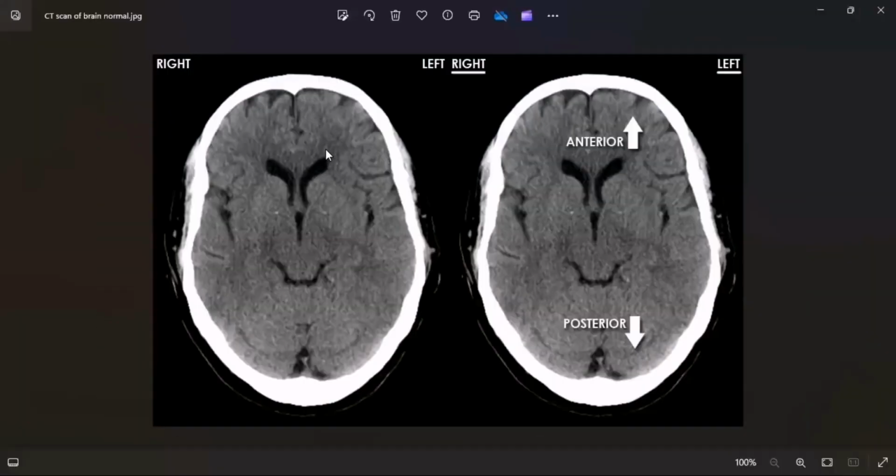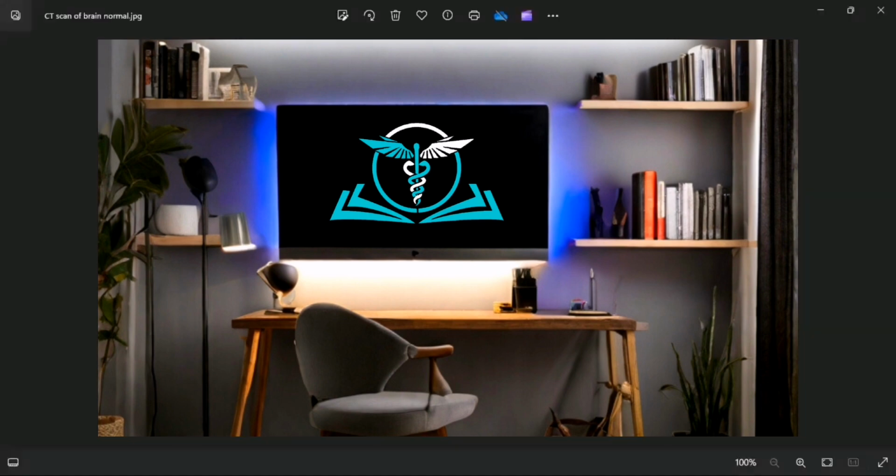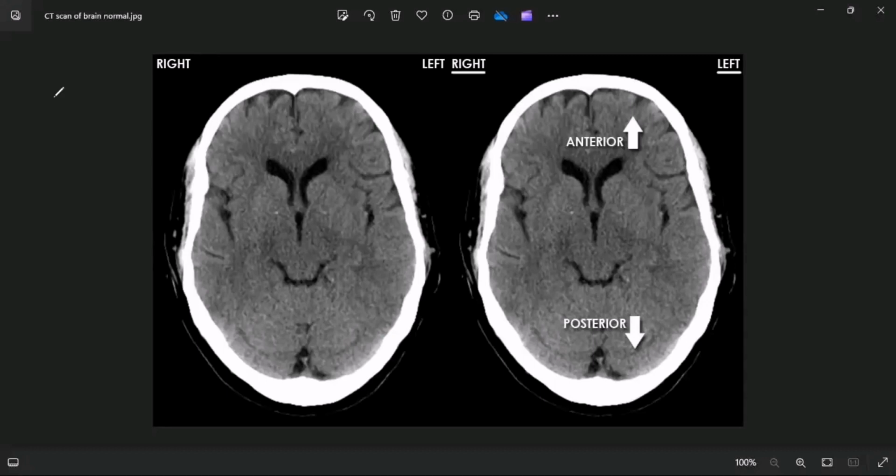So if you are a lesion which is whiter than the brain, do you see how the density is, or how the whiteness is? If you are a lesion that is whiter than the brain, just like the bone, do you see that the bone is also whiter than the brain? You describe it in density. But the point remains that if you are whiter than the brain, we say you are hyperdense when using the CT scan.